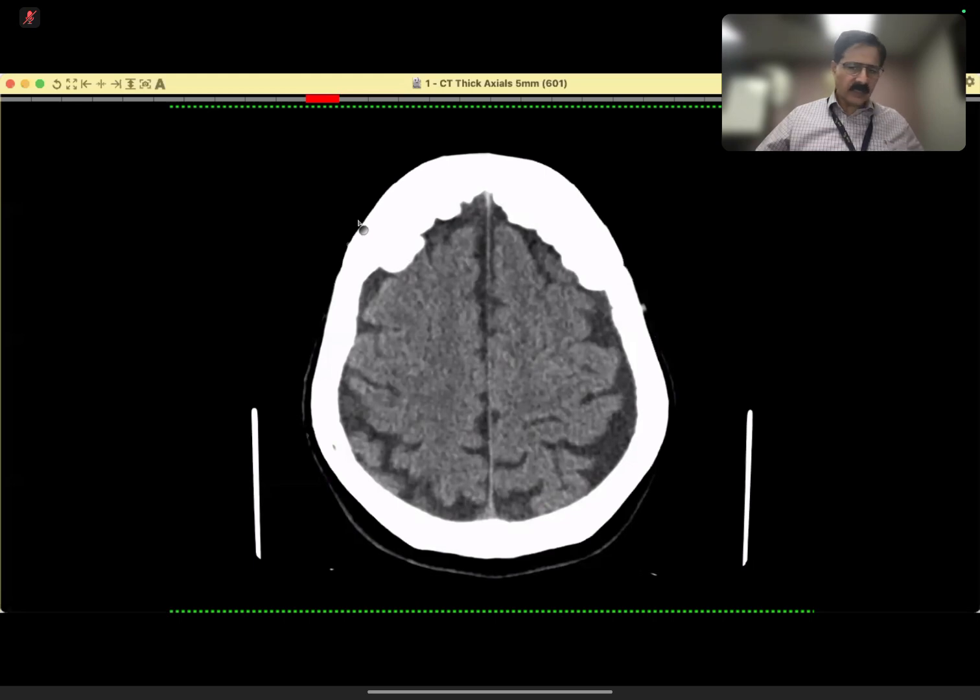So this is candidate 3. This is a 77-year-old female, again an A&E case. She fell down in her bathtub and hit her head, and she has an occipital region scalp hematoma, eyebrow scalp hematoma, and dizziness. So that was the impact on the skull. Over to you.